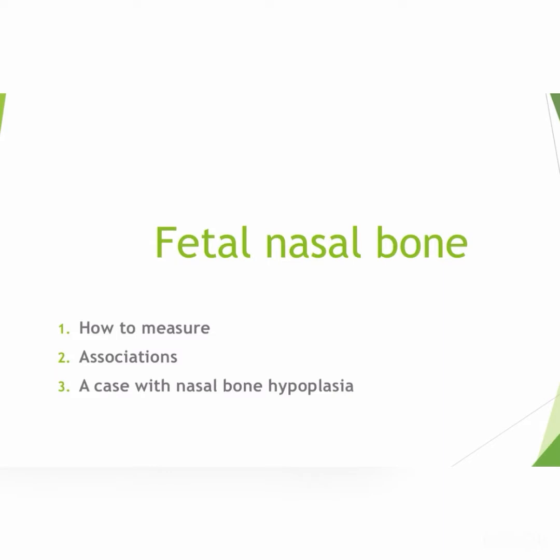First of all, we will talk about how to measure fetal nasal bone. Then we will discuss fetal nasal bone hypoplasia associations with other anomalies and fetal syndromes. And at the end, we will review a case with nasal bone hypoplasia.